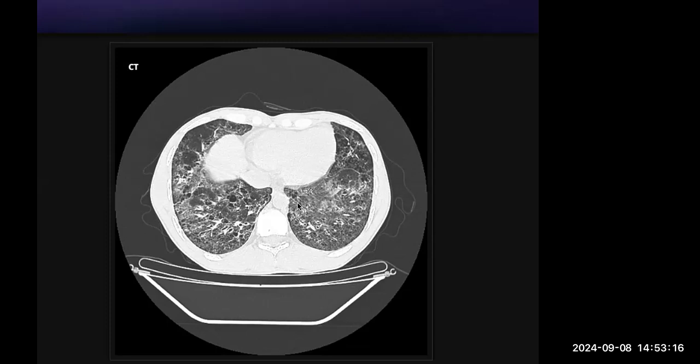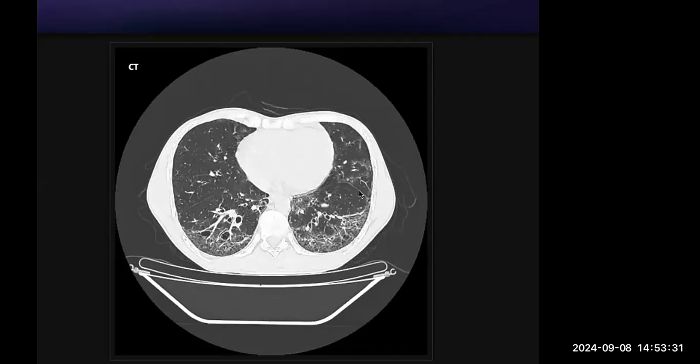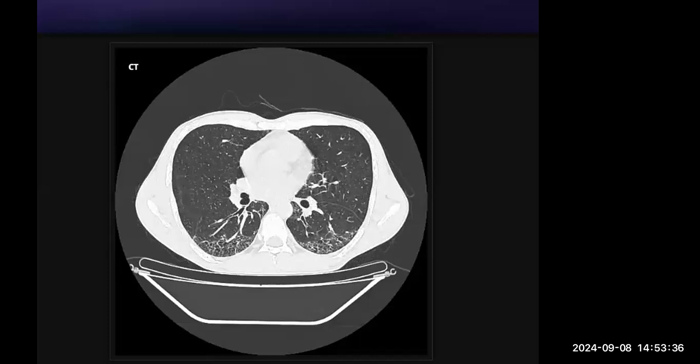So you said myositis is one of the differentials. What are the other GI manifestations for this condition? GI manifestations for myositis, I'm not sure about GI manifestations of myositis. Yeah, that's fine. You can leave the mouse.